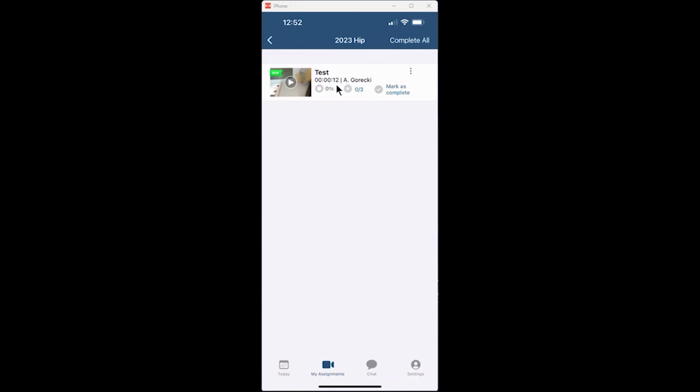They've got a title. They've got a length. They've got the provider who made the video. They've also got recommended views per day or treatment sessions per day. This was 3. Each time they watch it, it gives them credit. It fills the ring if they get 100% of the videos done. If they've memorized the video, which a lot of people do as time goes on, they can hit Mark as complete. Mark as complete also gives them credit for that.